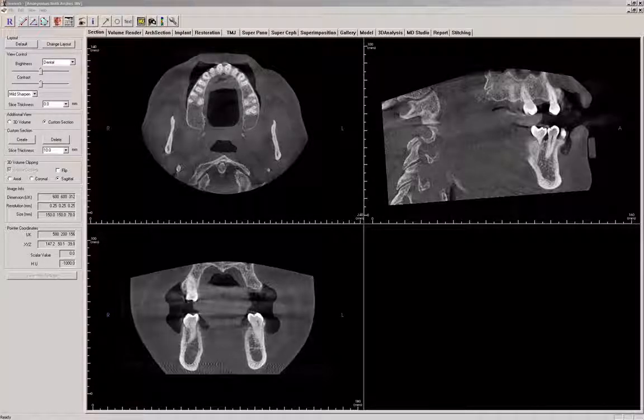A learning strategy experience that I have seen work pretty well is for you to pause a tutorial as needed and apply the instruction to a case that you have loaded into Invivo. It is also helpful to have the Invivo reference manual available to further understanding. The Invivo reference manual should have been provided to you in digital form when you purchased your scanner. If you did not receive one or cannot locate it, call technical support.